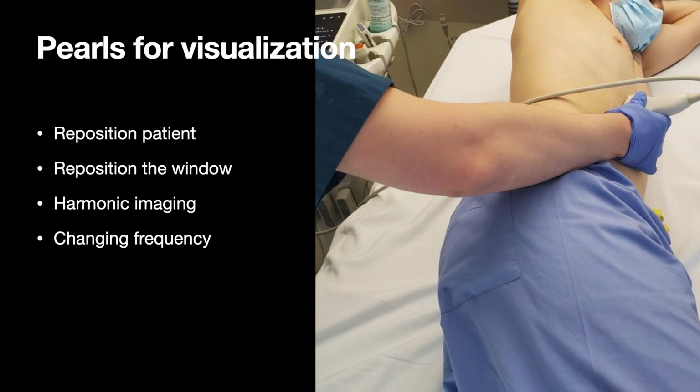So with that said, we're going to wrap things up here. What we talked about, by brief review today, is the scope of biliary disease, why we're doing this, and then the normal anatomy and physiology of the gallbladder: how it contracts, what causes it to contract, where it is, and what the structures around it are that we're going to be seeing. And then we applied ultrasound to that to see how we can visualize what we knew to be true from an anatomic standpoint. We saw how that works with the gallbladder ultrasound, how we can get the long and short axis, some of our measurements, and what it's going to look like on the ultrasound.